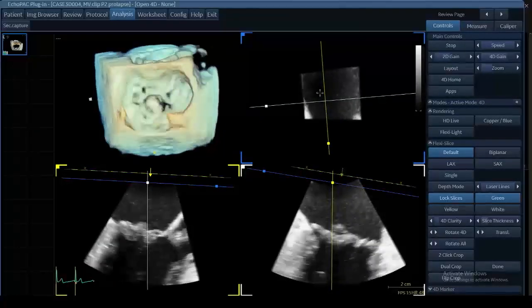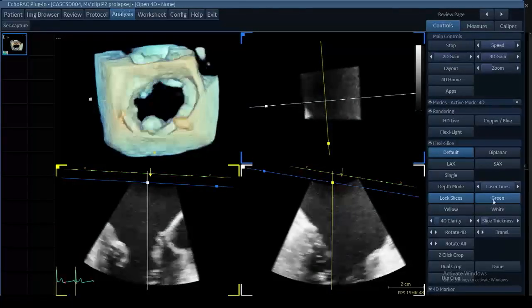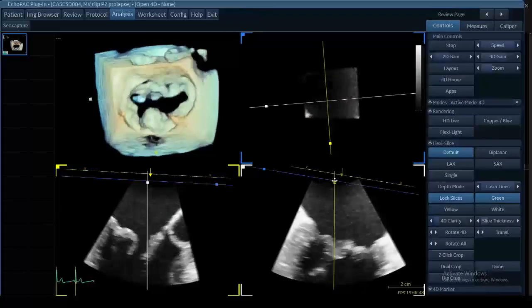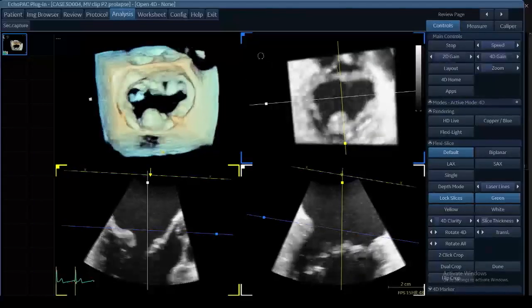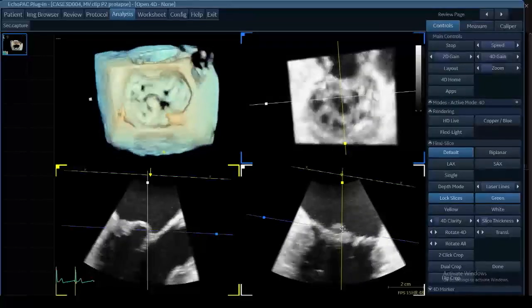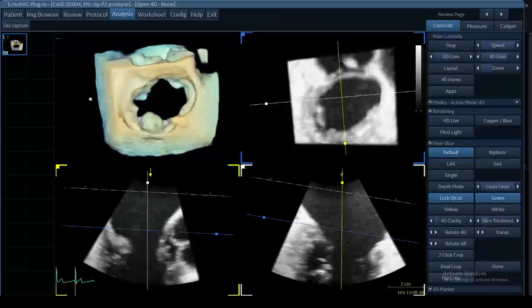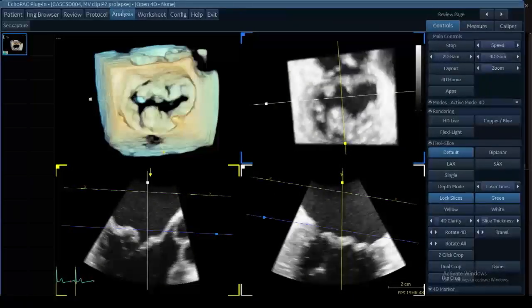Can I change which one is the reference plane? Yes, you can change it. And you can see here by the color, so you can decide which one you want to mirror. In this case, we're mirroring the green. So how do we go? We first go down, and then we're mirroring the blue plane here. You made a little mistake, green is supposed to be blue. So the color is blue. You guys aren't colorblind, or maybe you are, but that's not causing the problem here. So the blue plane, if you look over on the right, is called the green plane.